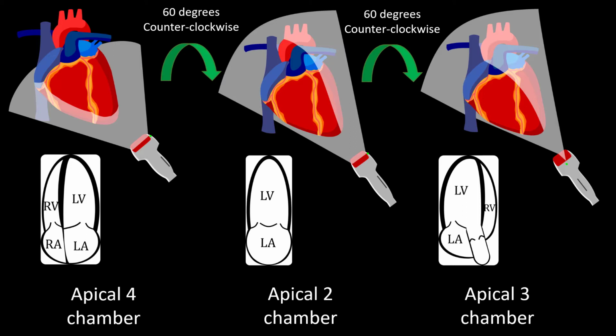Having all three views gives you a full appreciation of all cardiac walls, making LV systolic function and regional wall motion abnormalities assessment complete.